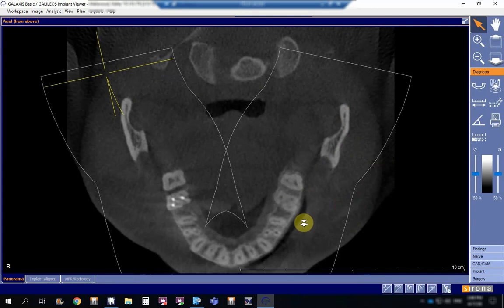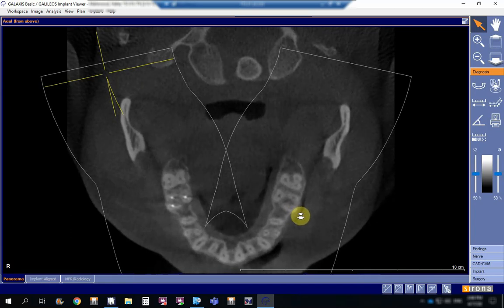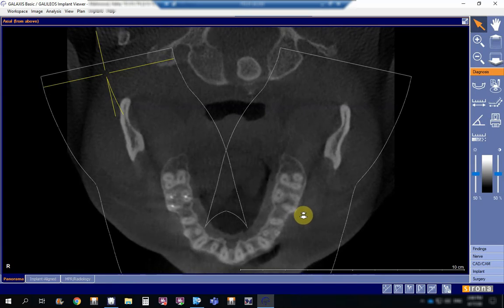I'm going up. See here that this tooth is root canal filled. This is the 6, and this is the other 6. I can see here a distobuccal, mesiobuccal, and the palatal canal. Let us see if this tooth has an MB2 canal. No MB2 canal can be seen over here.